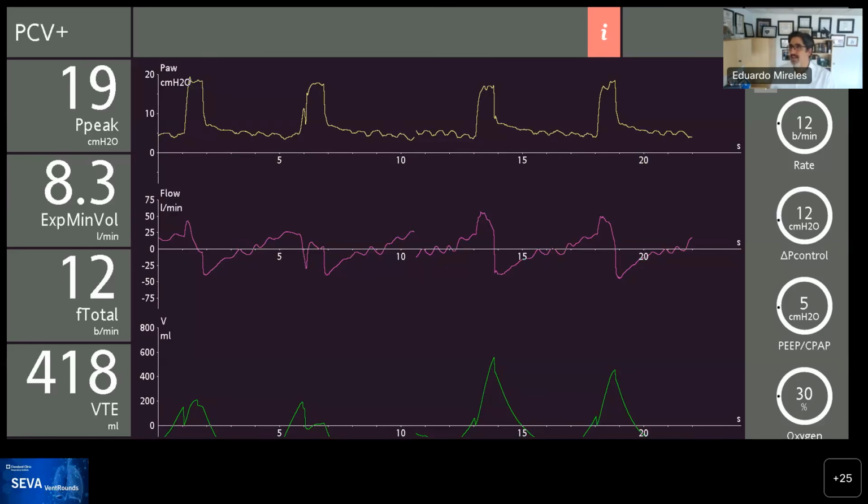And the first question for the group, and just put it in the chat, is what's the tag for this mode? This is a key item of what we're trying to define. It's important for us to know what's the breath control variable, what's the breath sequence, and what's the targeting scheme. So go at it. Have no fear.